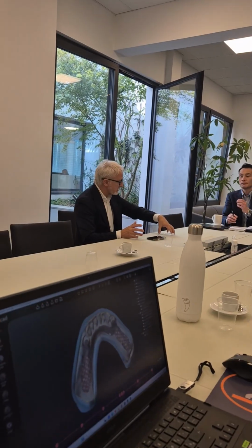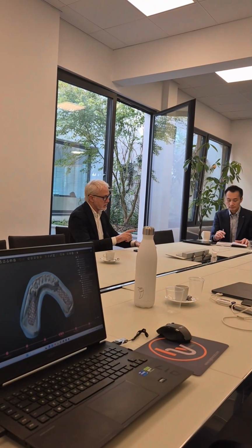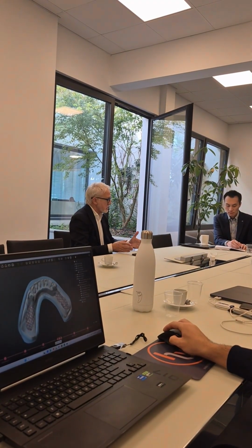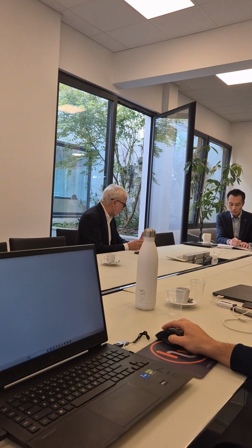And we changed the business model completely. So we can sell IpsoCAD through subscriptions, a monthly subscription like Netflix. We are starting at 79 euros per month for the base license, up to 129 per month. So that means that you, as a dental technician, can afford the investment.